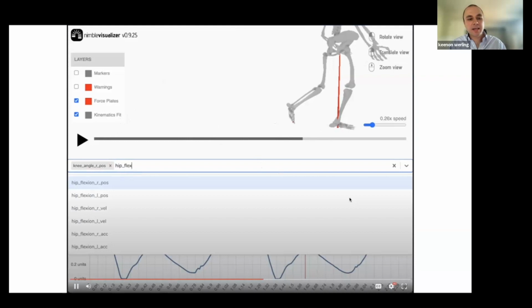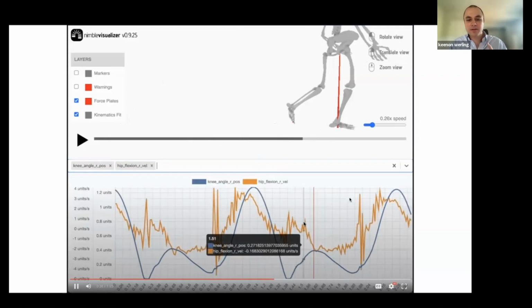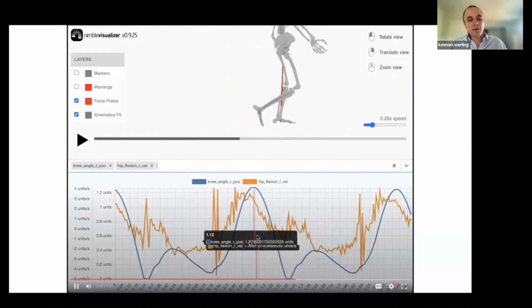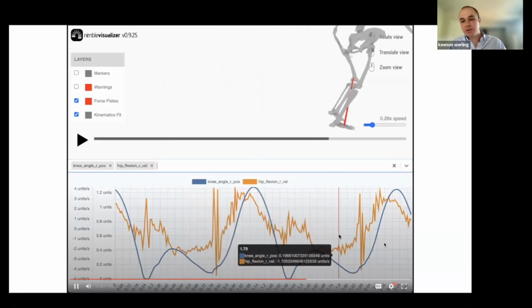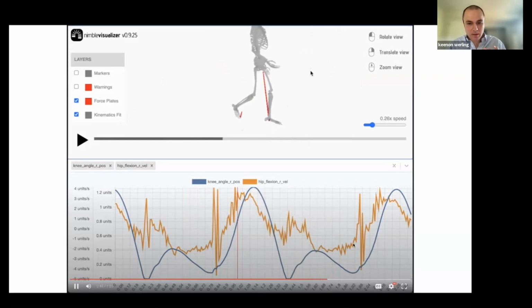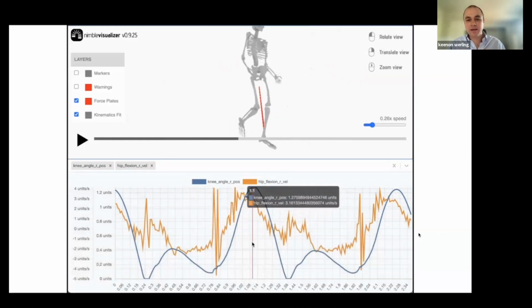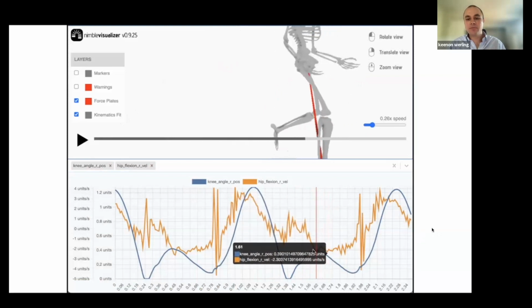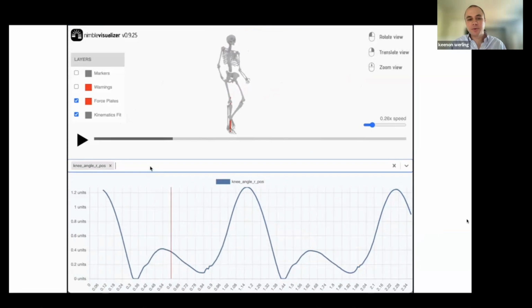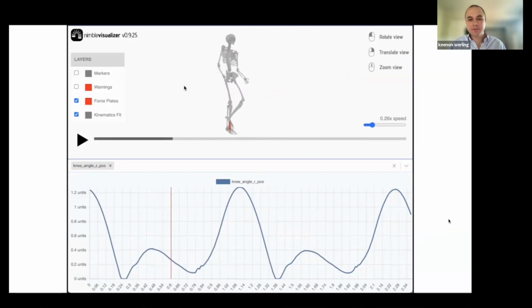And that's pretty much it. I can't wait for you guys to get your hands on this latest version here. I should say that the results here are unsmoothed, and you can go ahead and do smoothing after the fact. And we're also working on adding a cutoff frequency if you want to specify that in advance so that you can just use the visualizer directly without needing to maybe download the results.